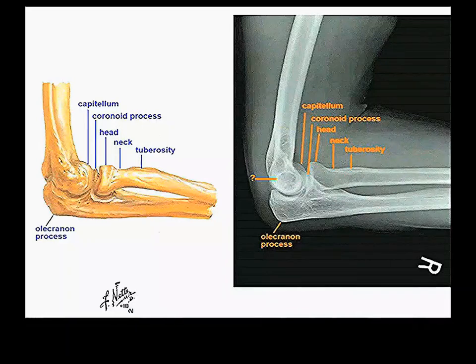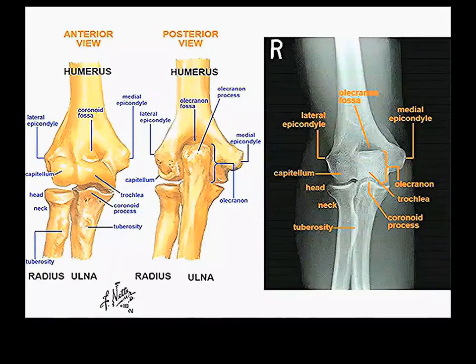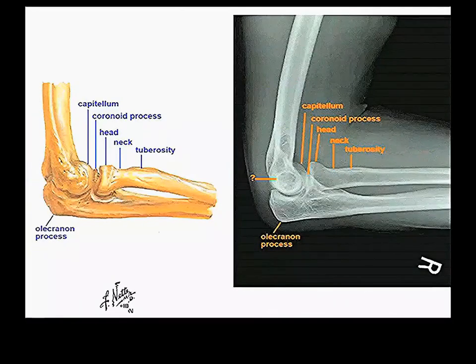This looks like it really should be something interesting. It's perfectly circular. And what it really is, you see it in lateral plane films, is that the spool of the trochlea has a groove, and that groove in the spool of the trochlea, when seen in lateral view, makes this perfect, beautiful circle. So that's just what it is. In case you might have thought it's an epicondyle of some sort, but it's not. It's just the groove in the trochlea.